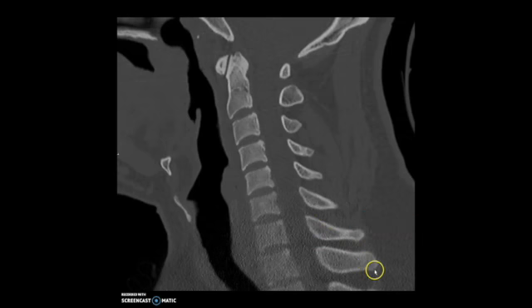So if you know that C7 is the first one, the next one after C7 is usually T1. This is not something I would base surgery on without counting, but I'm just saying that if you learn this pattern, you can often find where T1 is without counting.